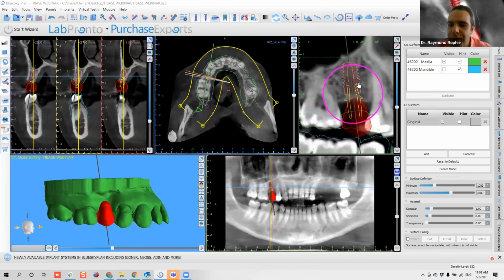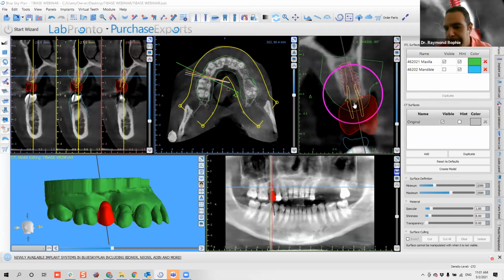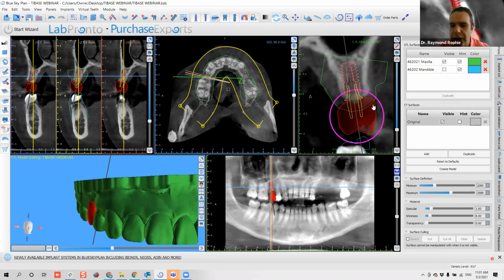Okay, so now you can see that you have your implant, your titanium base, and the wax up crown that you're doing with the ovate shape. So this seems that it will work very well. This will have an anatomic shape, and this will have an emergence profile, subcritical and critical contours that will be ideal for us, so that we can now create a crown, right? Where we can 3D print this and use it with our patients.